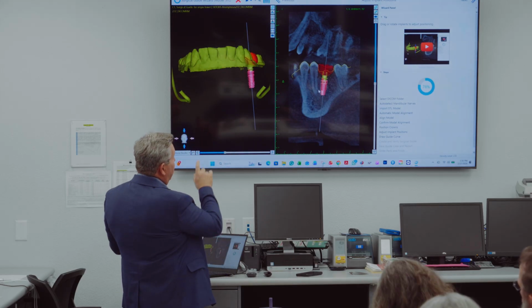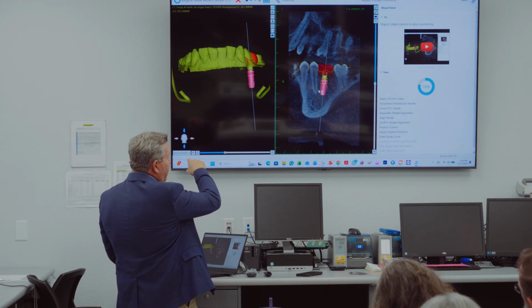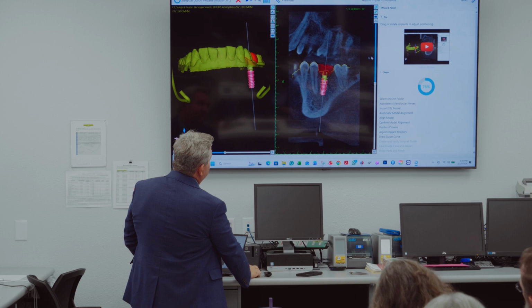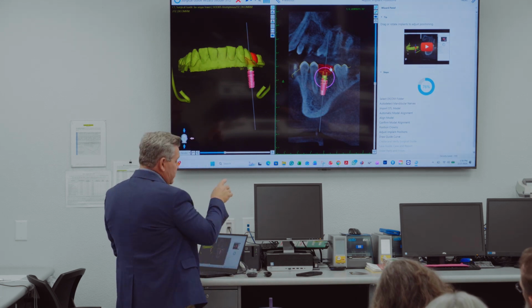So had we imported an occlusal model, there would have been a step for that to add it to the top, so we'd have an occlusion. And I've got slides that show that. I'll show it to you in a second. And you need to affect that. We could mess with the tooth.